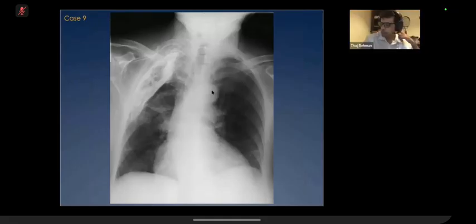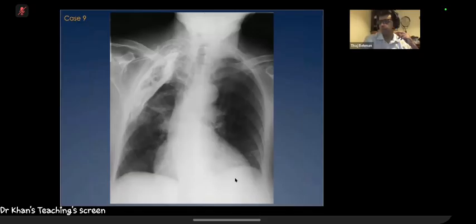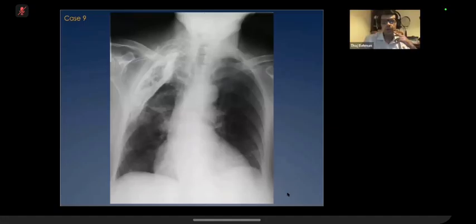So I can see an extremely hyperdense extrinsic or pleural-based opacity over the right upper zone. It looks like it's heavily calcified. I can see that the overlying chest wall is abnormal. I cannot see any other pleural plaques. So how would you put the diagnosis for this?